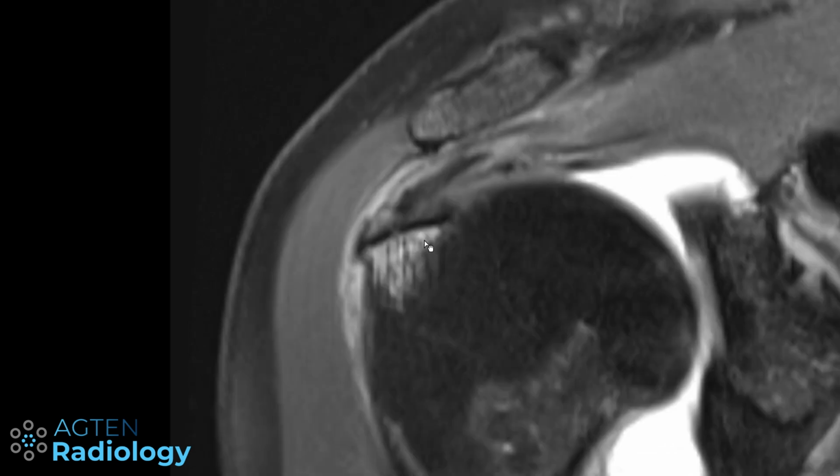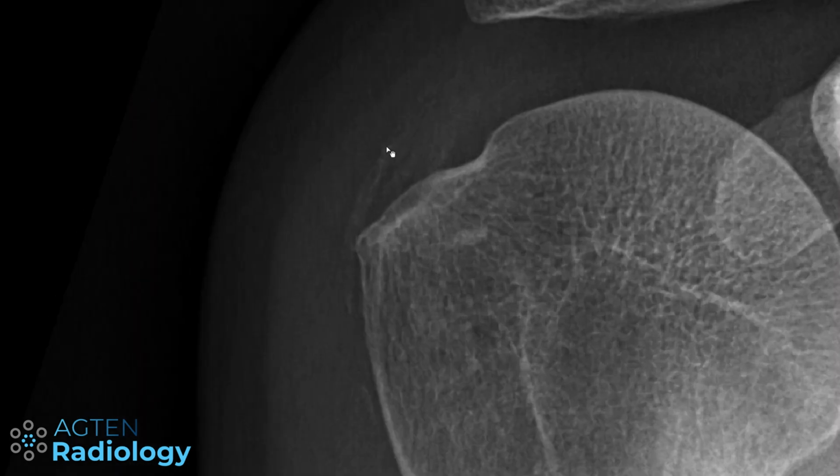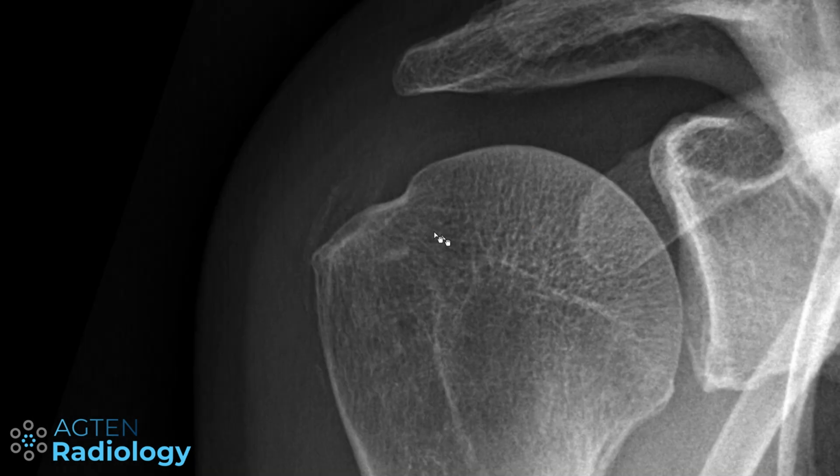Now this is a typical differential diagnosis that you should have in mind, because this here is actually calcifications, and in this specific patient hydroxyapatite, as you can also see on the radiograph here. So we have to be careful not to call tendinosis when in fact it's just a calcific tendinitis. Here with breach of the calcifications into the subdeltoid bursa, as you can see here, causing inflammation of the bursa with corresponding bursitis.